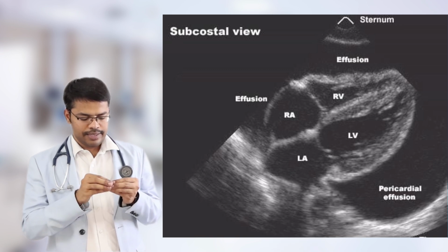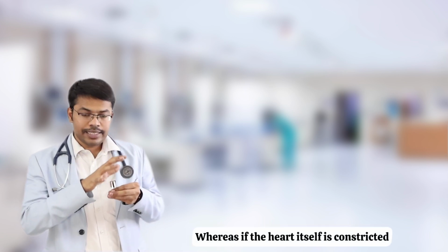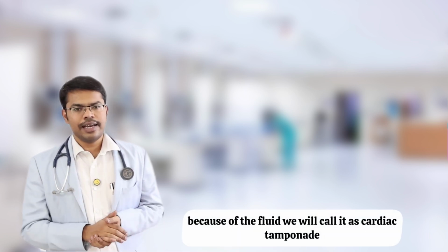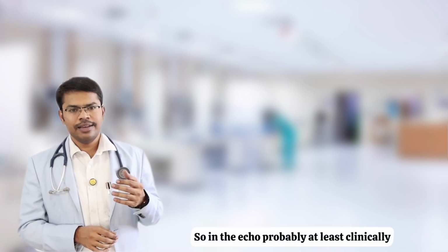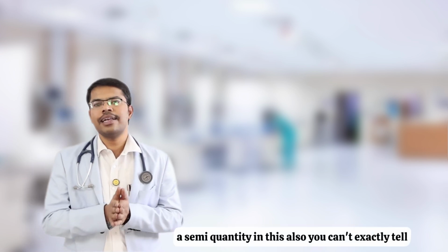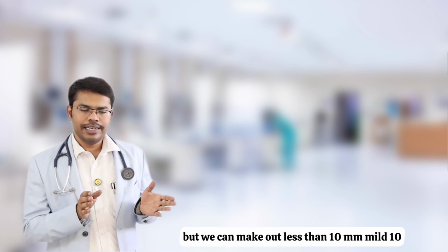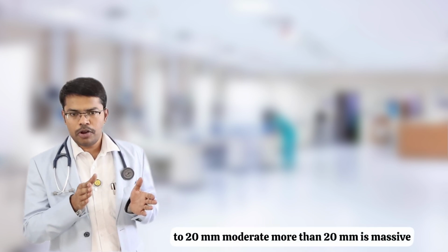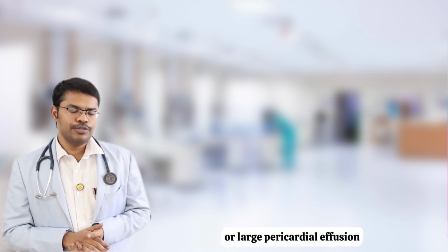Technically, end diastolic time is nothing but when the heart is relaxed, so that you are able to see. Whereas if the heart itself is constricted because of the fluid, we will call it cardiac tamponade. That is a very severe form of it. So in the echo, at least clinically, it is semi-quantitative. In this also you can't exactly tell how much it is, but we can make out less than 10 mm mild, 10 to 20 mm moderate, more than 20 mm is massive or large pericardial effusion.